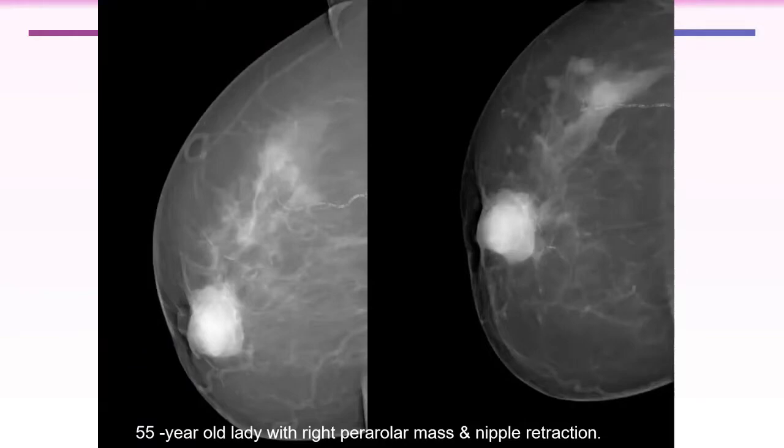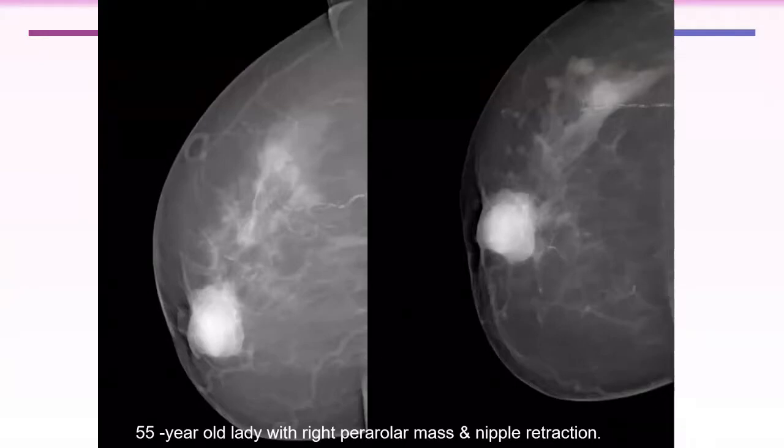Maybe, with what previous. We said we have to judge by the most suspicious features. Is there any suspicious features in this image? Nipple retraction and inversion or retraction, focal skin thickening. Yes. So at least this it will be BI-RADS.